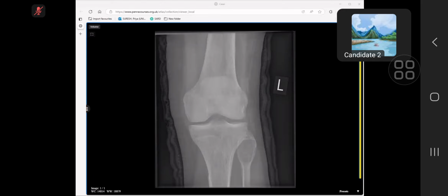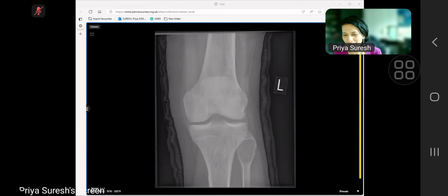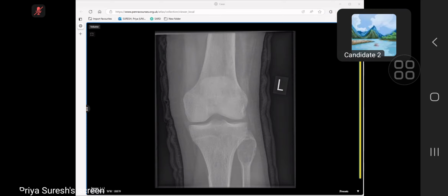Can I see any MRI if it is done for this patient? No, we got the diagnosis with the plain film, so we didn't proceed to MR. Okay. It is likely ABC. As it is a skeleton which has just fused, I will still consider the ABC as the first differential. Second likely possibility can be GCT. It usually reaches the epiphyseal subarticular surface. So I will keep that second in the differential.